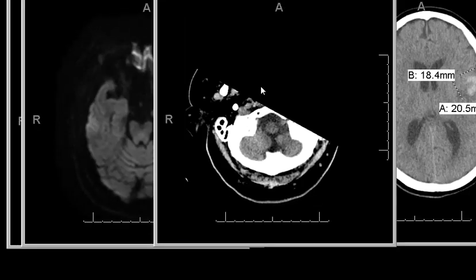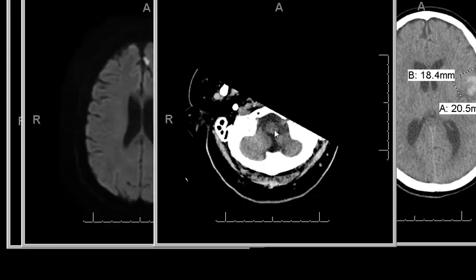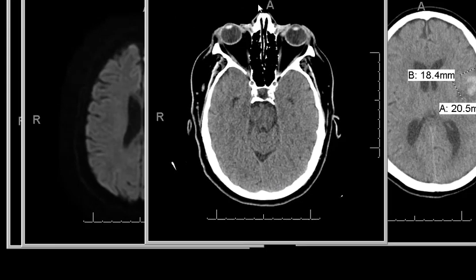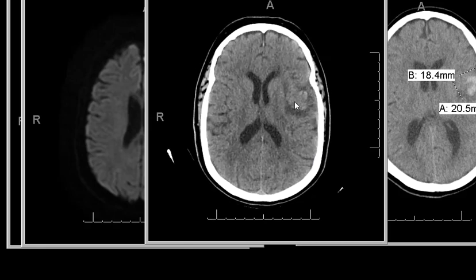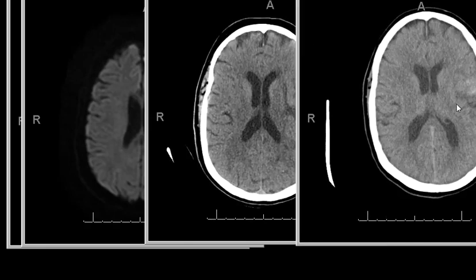Here's the follow-up MRI of the stroke. This is a follow-up CT. It shows the stroke, and the contrast is gone. It used to be there.